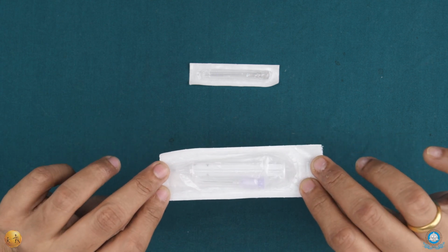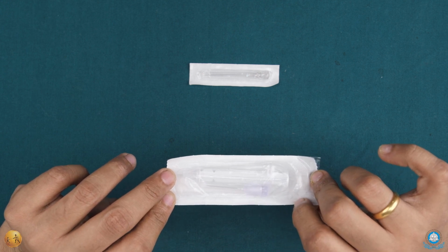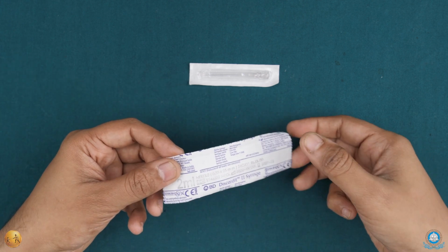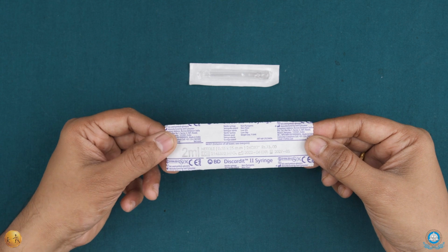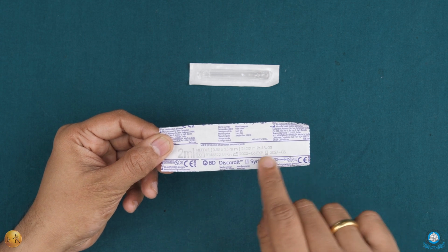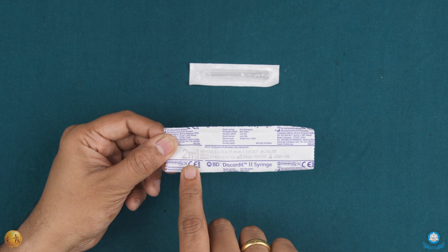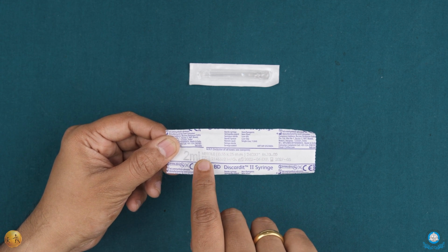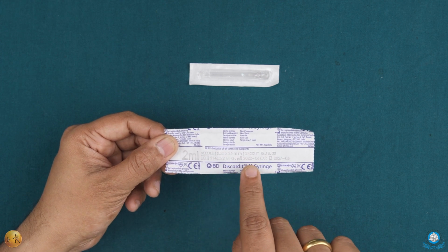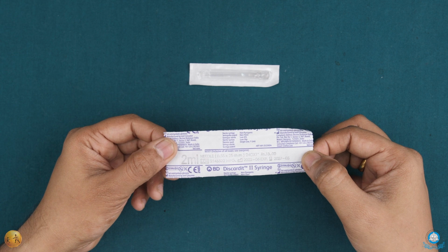Now in this packaging, this is a 2 ml syringe. You notice that it has a syringe as well as a needle in it. Now before you actually open this, please note that you should always read the labeling on the back. Now if you notice here clearly, there are a few pointers, right? And there are a few symbols on the side. Okay. So first of all, let's understand that this is a 2 ml syringe. Okay. Now there are some specifications given vis-a-vis the needle itself. Now along with that, you have to always remember to also check the manufacturing date as well as the expiry date. Now if you notice, this is very much within the expiry date.